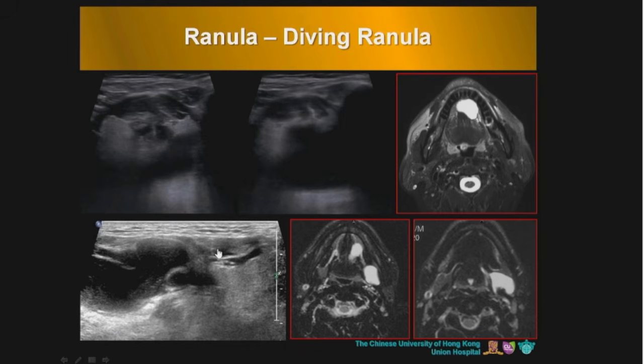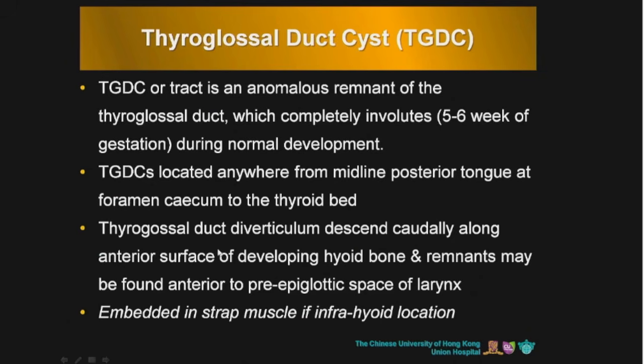So just because it is crossing the mylohyoid, it starts in the sublingual, crosses the mylohyoid, enters the submandibular space, by its anatomical definition, I know that this is going to be a diving ranula or a plunging ranula, and an MR confirms both, the ranula on top and the diving ranula below. So again, simply based on anatomy, what it does, not what it looks. So what it looks is part 2. Very often you do not even require what it looks because part 1 will tell you the diagnosis.